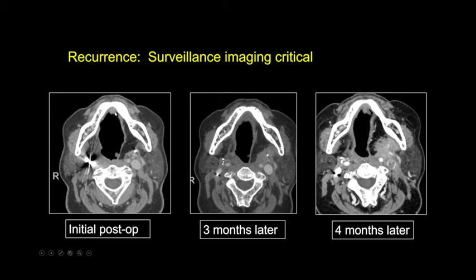They can look carefully to see if this is edematous mucosa or some candidiasis. This is not a mass. This was fine. And the lateral wall of the oral cavity and the pharynx have been reconstructed here with a predominantly fatty flap. The neoluminal surface looks good. This looks mucoid density, and it's also easily examined. And deep to this fatty flap, I don't see any mass or abnormal enhancement.